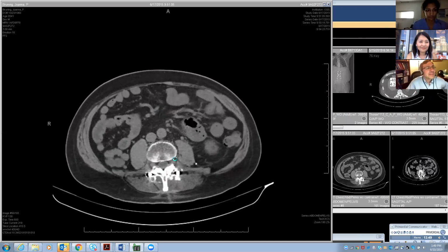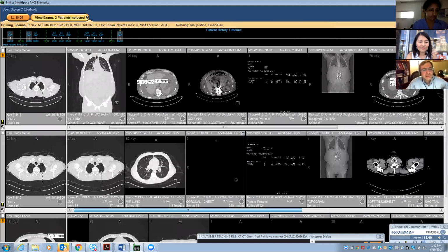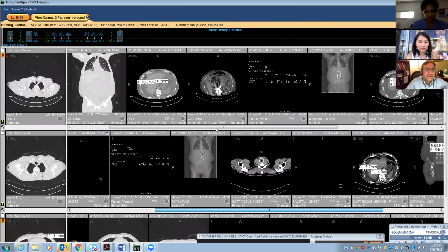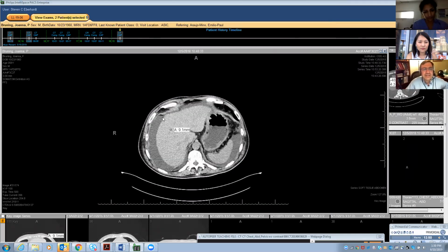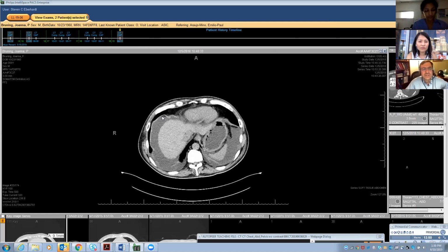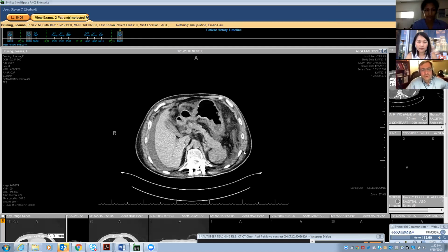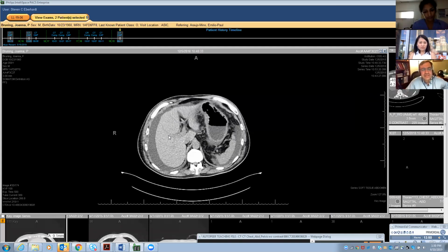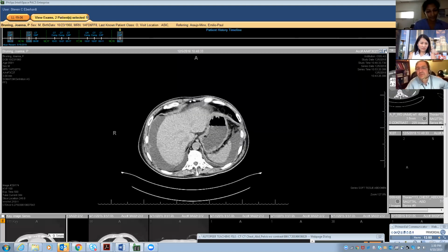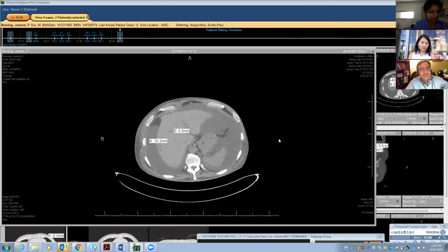And it's really in the last two cases, you can see it very subtly on this more recent one. The annotations there are just looking at some of the liver lesions again, but you can see very subtly here a kind of fluid level in the ascites. So the patient ended up developing ascites. Because there's not gross peritoneal disease, even though this patient has metastatic disease, it's not clear exactly if it's a malignant ascites or a non-malignant ascites, but there is this subtle fluid level. It was missed on this occasion. That was December 2018, but it became considerably more obvious on this one here, which is more recent.